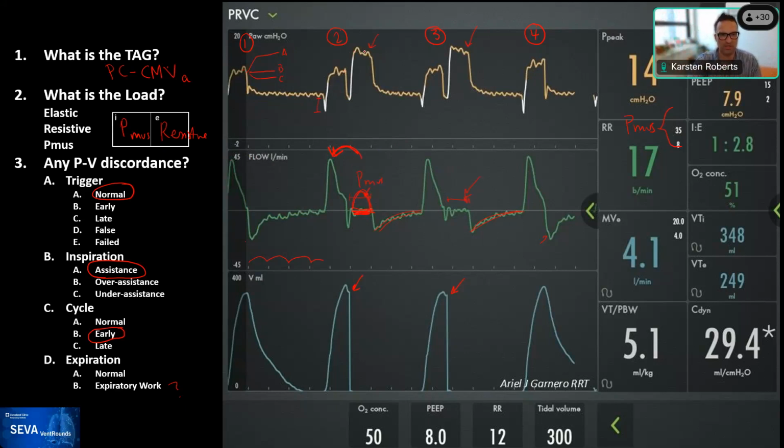And so this is really, with a zero flow state, a plateau pressure, as compared to the breaths that are mandatory from the ventilator.